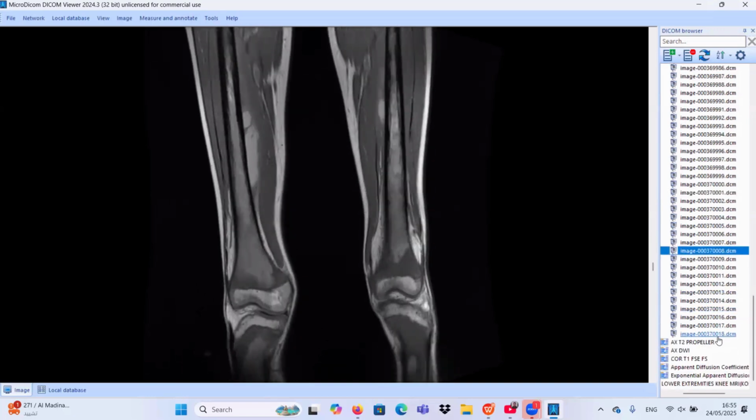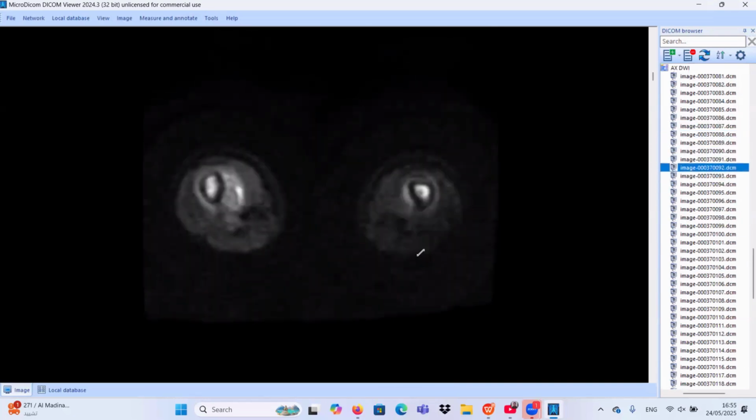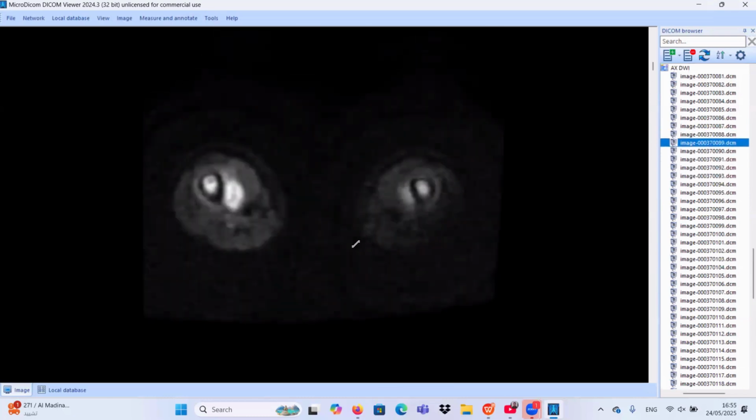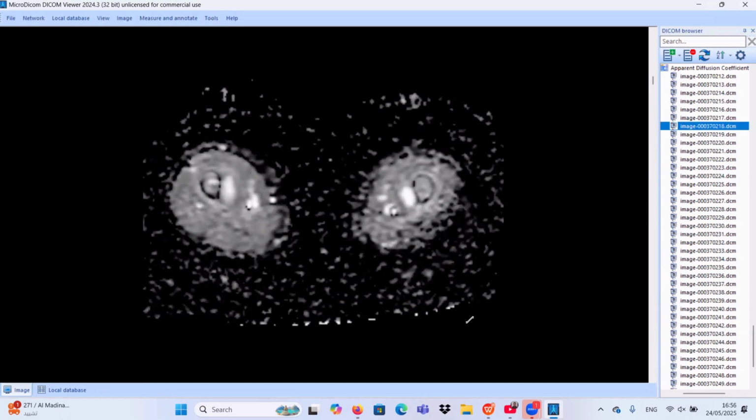Yes. Okay, and also if we try to see the diffusion-weighted images, I think there is some distortion of the image in this area. Also, if you find something like high signal in the diffusion, you should correlate with the ADC map. What do you think of the ADC map? No true restriction. So the other differential diagnosis is subperiosteal abscess or salmonella infection, but I think this one is going to be subperiosteal hemorrhage, not abscess, one of the complications of the osteonecrosis.